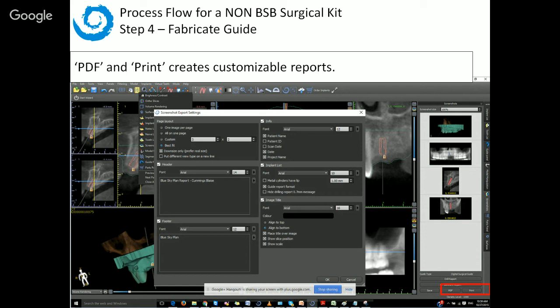Again, in the normal mode, we gave a built-in report that is helpful to many users. If you want to customize exactly the layout, what goes into the header, what goes into the footer, all of that could be done from the panel.